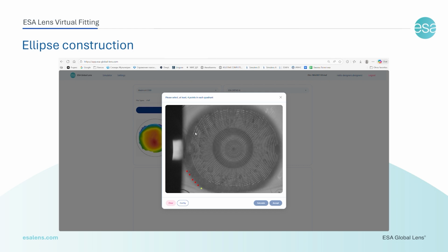In certain scenarios, you can use the right mouse button to force the placement of measurement points, which will appear as green immediately. However, it is best practice to use this feature sparingly.